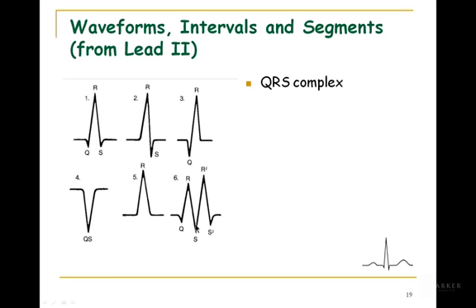And some people have what we call, well, there could be multiple variations. This is a QRS, R prime, S prime. R prime, if it goes back above baseline, that's an R prime. If it goes back below baseline, they call it an S prime. I've actually seen R double primes and S double primes where it went up again. I refer to this as the bunny ears. All of these may be considered to be normal as long as the duration of that complex is fine. So even having these bunny ears may be perfectly fine if the duration is fine.